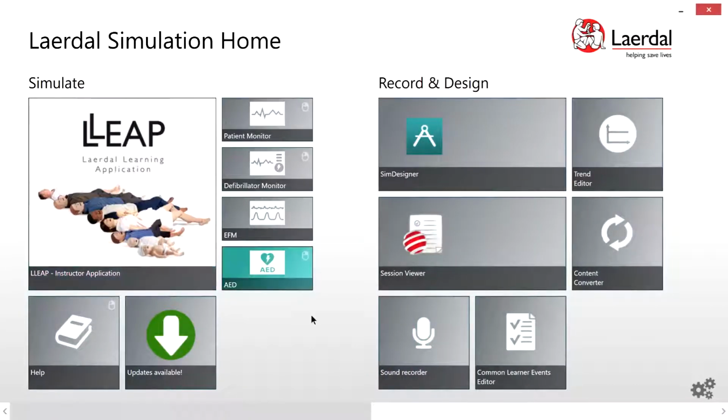If you're ever worried about what version am I running, just hover your mouse over it. It'll pop up right there. And they're about to come out with a new version 7 fairly soon, within the next couple of weeks or so. Let's go ahead and jump into seeing what we can do here.